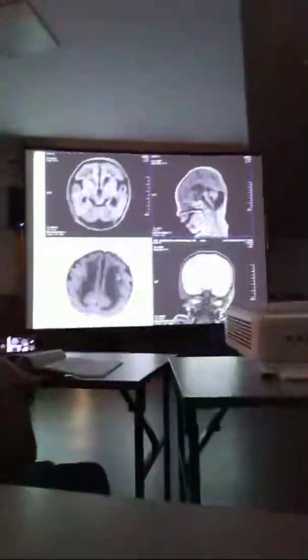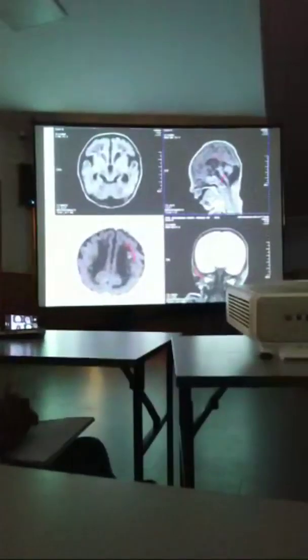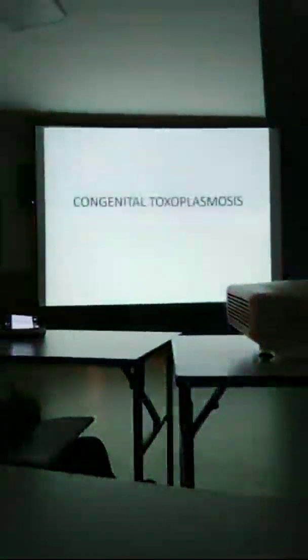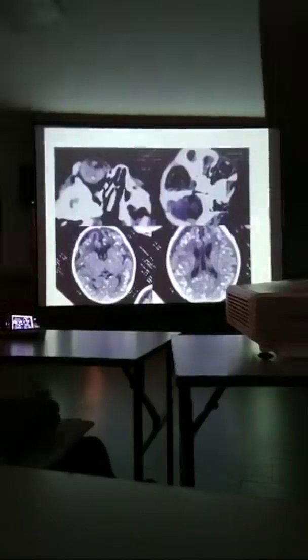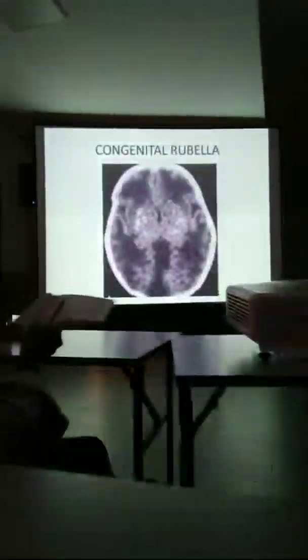Virus infection. We can notice the microcephaly, malformations, and the hypomyelination. You can see the white matter bright in the temporal region. These are all typical manifestations of cytomegalovirus infection. Toxoplasmosis: chorioretinitis is the prime manifestation, along with parenchymal calcifications and parenchymal destructive lesions with tissue loss. These are all the manifestations of congenital toxoplasmosis.